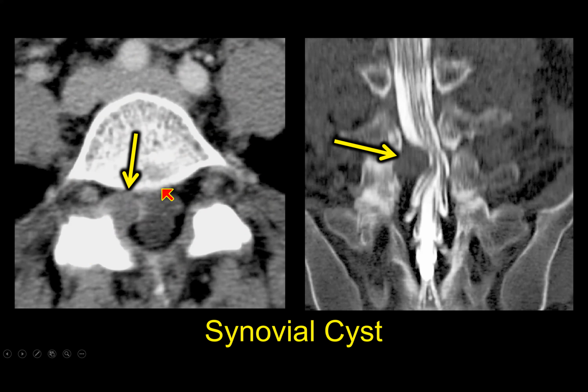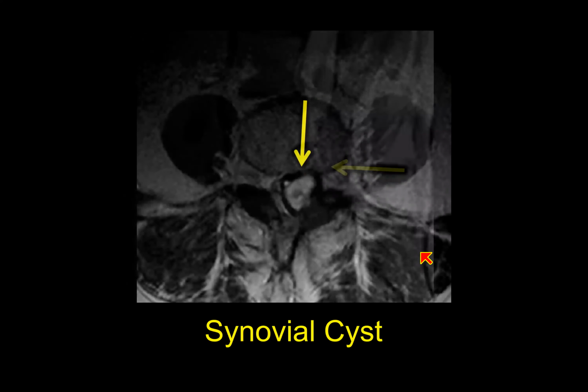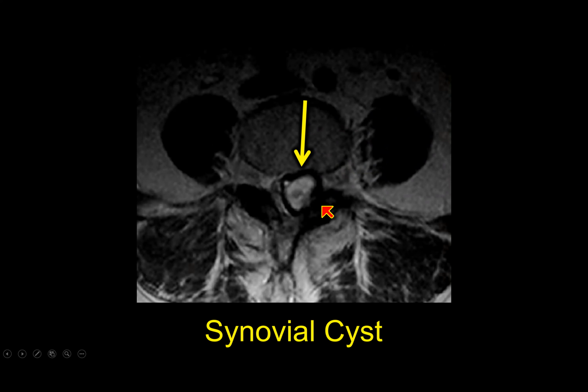And what we think about as that central and subarticular, what used to be called the lateral recess area, that fluid density of a synovial cyst impinging the thecal sac significantly at that level. So fluid density on CT or intensity on MR with a synovial cyst going back here, we see on a sagittal T2, can significantly impinge on the thecal sac at that level. And again, we think about those locations on the sagittal as well as the axial with that fluid coming from that synovial joint going up.